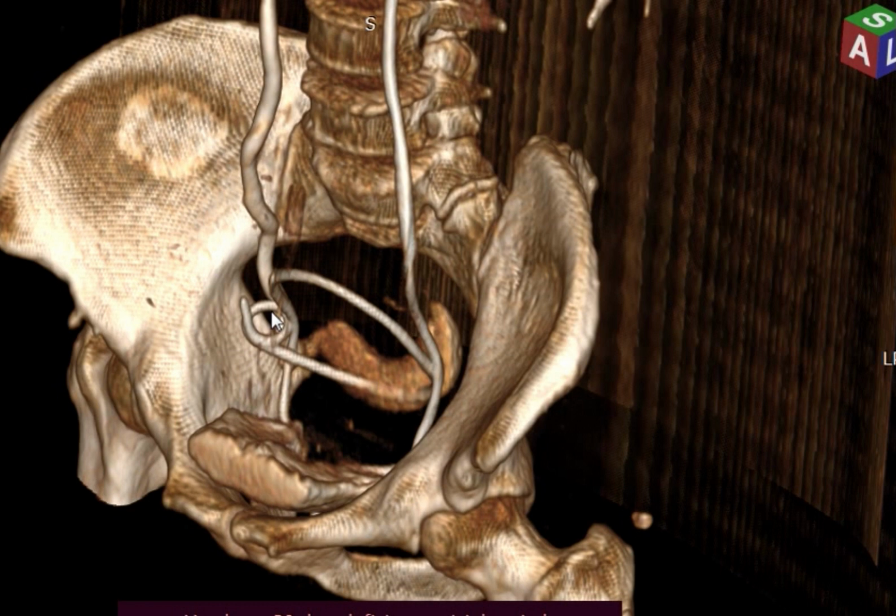The most common cause of ureteric injury is hysterectomy. So what happened? The gynecologist went in, took the uterus, and took the right ureter with it. And then the urologist put the double J on the left, it's okay. On the right, the ureter is injured. It went out. So the distal part of the catheter is in the urinary bladder. And the proximal part is in the lower part of the ureter, and the vagina, before the injury.